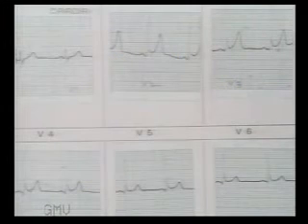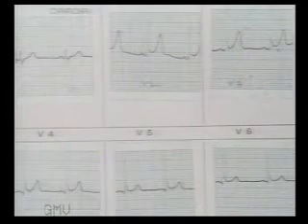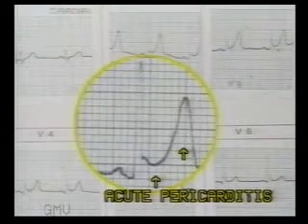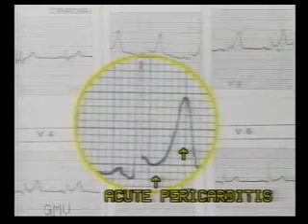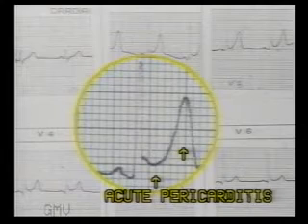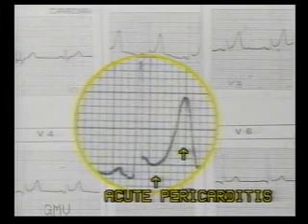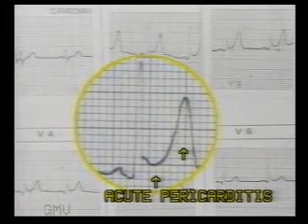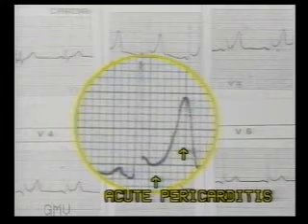So ST segment elevation is seen in all leads, anterior and posterior, and chest and limb leads. Though sometimes all leads may not show ST elevation, causing a confusing picture. But reciprocal ST depression will never be seen in pericarditis. So reciprocal ST depression rules out acute pericarditis.